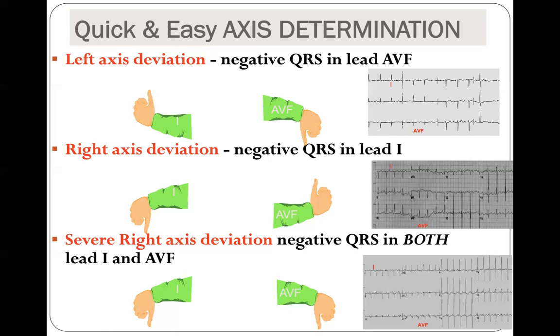Happy to be with you in this video, and in the coming small series of videos we will discuss the different parts of the ECG waves, segments and intervals, and know what is normal and what is abnormal, and what are the pathologies that we can diagnose using this.